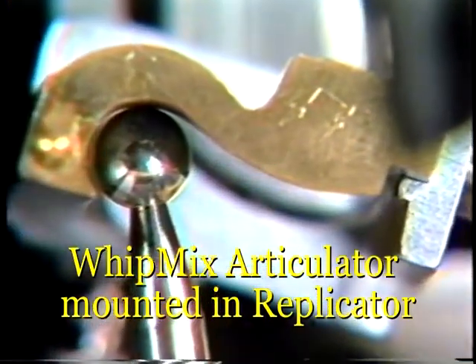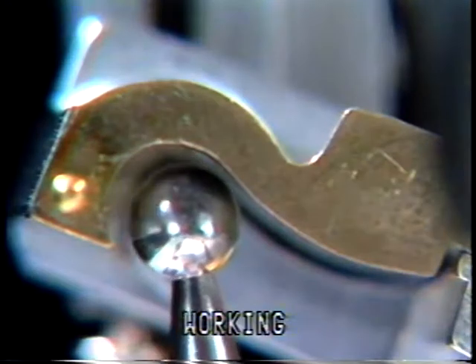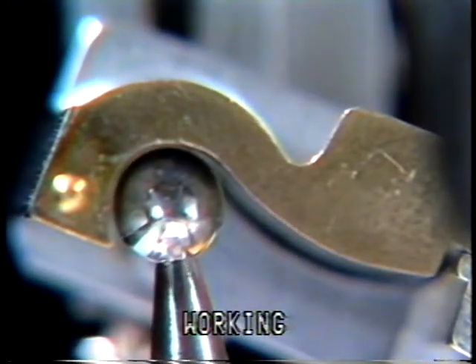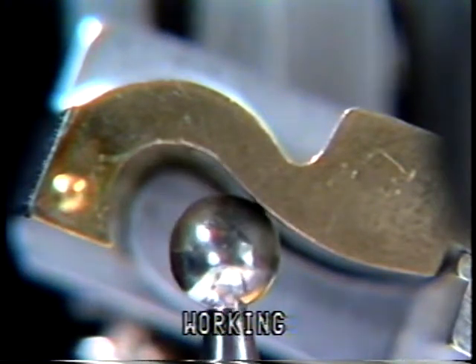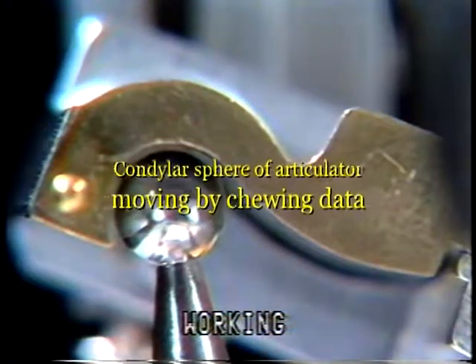The replicator had the unique capability of relating a subject's actual condyle movements during chewing with the condylar controls of articulators, a demonstration dentists had never seen before in any previous studies.